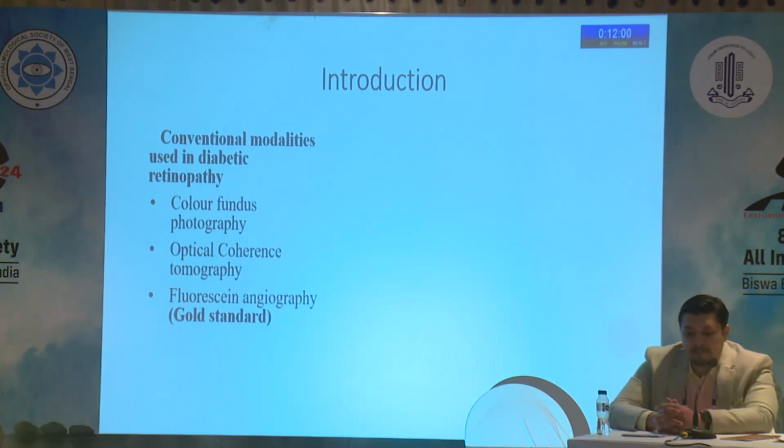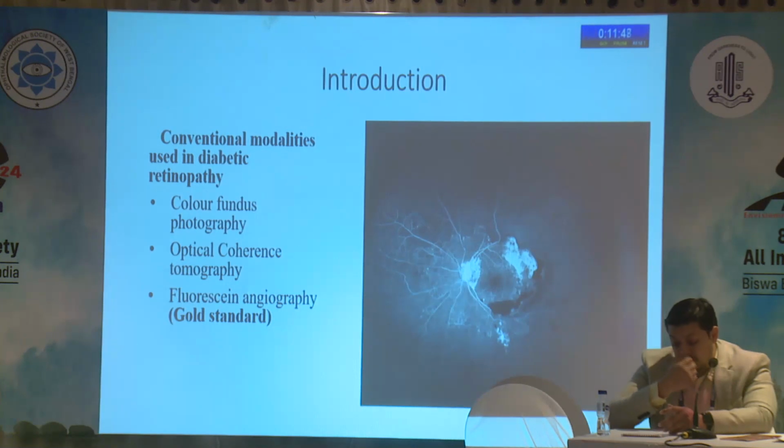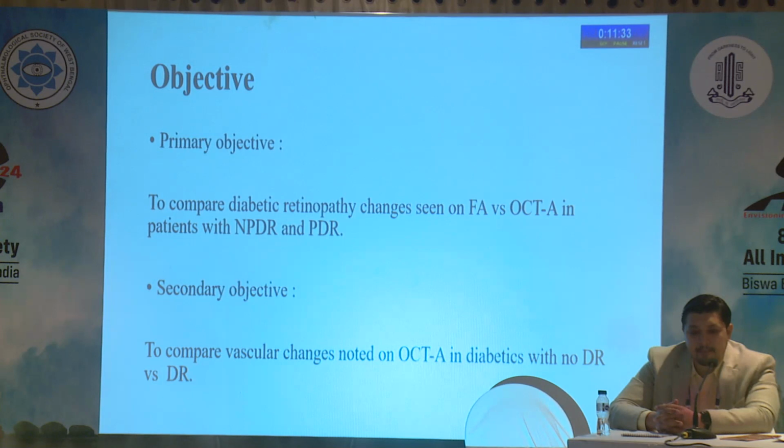We were limited by the view traditionally, but since the advent of ultra wide field imaging, I think the fluorescein angiography images we get in patients with diabetic retinopathy are awesome. It takes 2 to 3 minutes, but what it gives is indispensable. And I still continue to keep on doing ultra wide field angiographies in these patients. So I'll come to our work first.